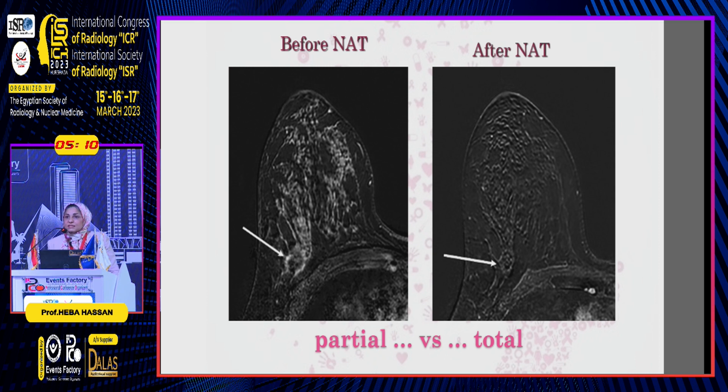Another thing that is very crucial for you to know is the type of management that your patient is receiving. If she's receiving one of the taxanes family, this means that you are anticipating what we call an anti-angiogenic effect, meaning that this therapy would decrease the tumor vascularity even if I have a residual tumor. As in this case here, this is a very well-defined mass, triple negative.